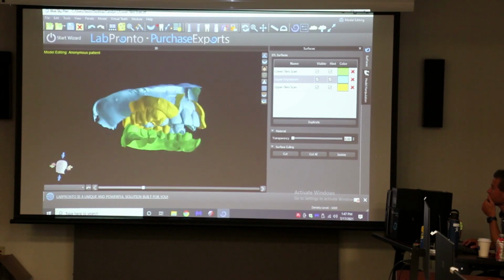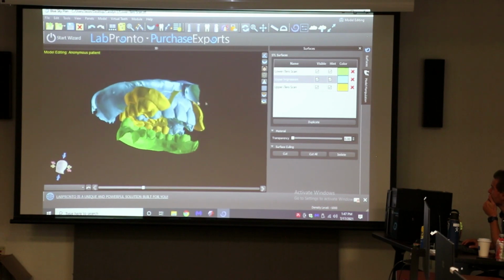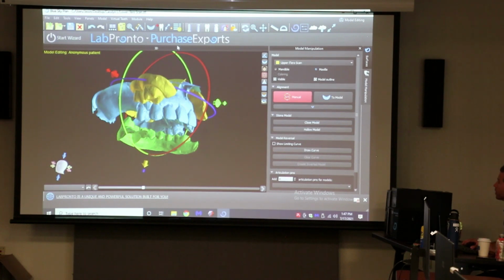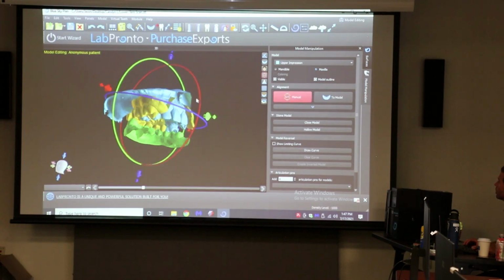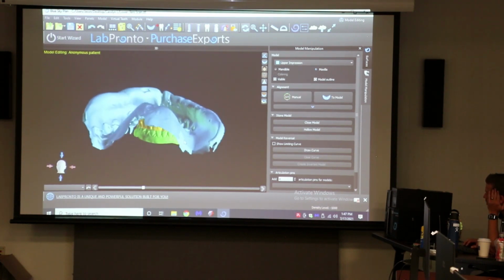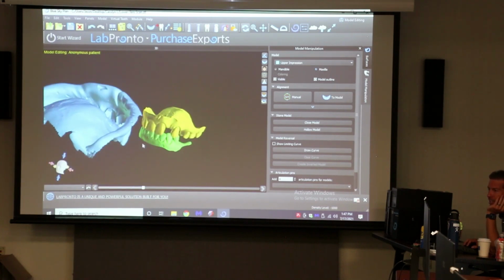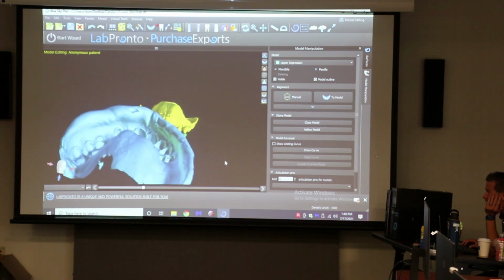It's like the inverse of an impression. It's really weird to look at that and think that's an impression, right? The blue, because it's like the inverse of the impression. Well, it's just a stone model. Well, but it gives you your intaglio as well, all in one. It's the teeth plus all the wash on the inside, because it's both sides at the same time. Do you get what I mean? The blue. Oh, it's not a stone model. You scanned the impression in the box scanner. Yes. Oh, yeah, sorry. So it gives you the teeth plus it gives you the other side. It gives you both sides. It's like an all-in-one denture, basically. Oh, that's why. But it's odd to think of it as an impression. It's not how you think about impressions, right? Anyway, it is for me.